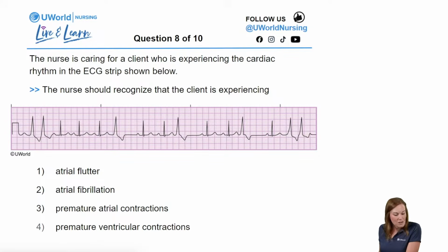All right, let us know what you're seeing. Let us know what your answer is. 30 seconds on the clock. Let's see what you guys think. Good answers coming in. Seeing a good mix of things, so we can spend a little bit more time on this one. But y'all are doing great.